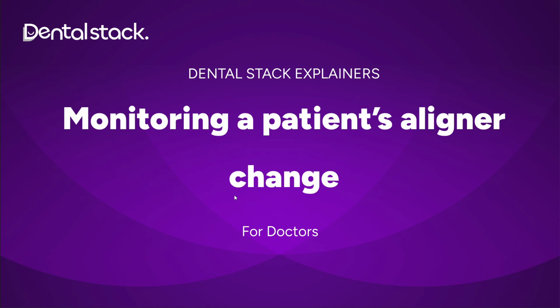And that's it. With this feature, aligner changes can be efficiently managed and reviewed by you, providing effective feedback on the patient's progress. If you have any concerns or questions, do reach out to us through our chat assist site.